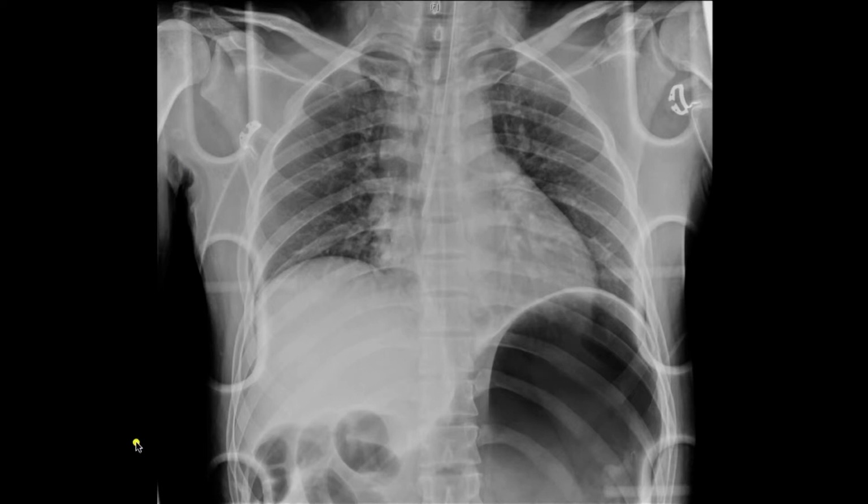So again, a patient is sitting there on a trauma board, and you can see that the endotracheal tube is clearly heading off in the region of the right main stem bronchus. However, we did see this before, that the patient has a very large gas-filled stomach bubble. So it makes it very suspicious that this is actually within the esophagus and not within the bronchus. So this is an esophageal intubation.